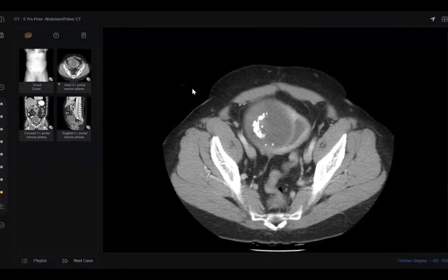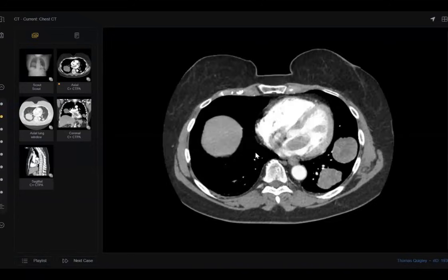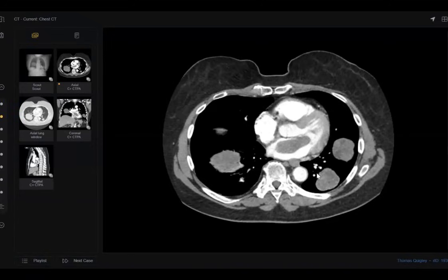Okay, thank you. I'd ask you one question. Why do you think I brought this case specifically in our session today? There may be some deceiving thing in this scan, which I want candidates to listen to something from you about. What is this?